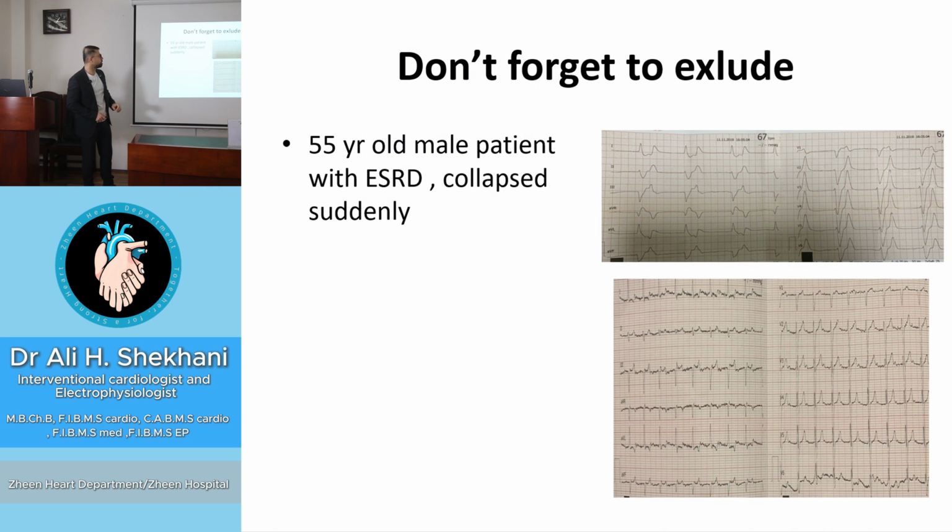This is the same ECG of the same patient. So always try to exclude the secondary cause of bradycardia.